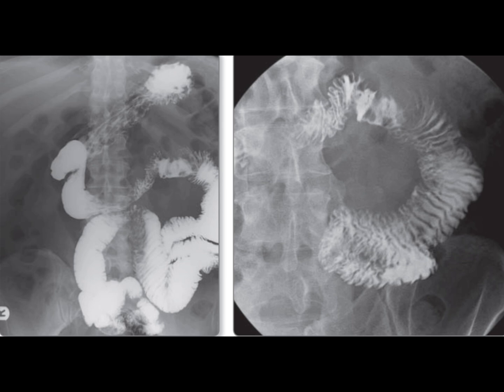If this mucosal-based lesion is confirmed to be solitary, definitive diagnosis could be achieved through endoscopic inspection and biopsy, given that the duodenojejunal flexure is generally accessible with conventional endoscopy. I would communicate these findings to the gastroenterology team for further evaluation.